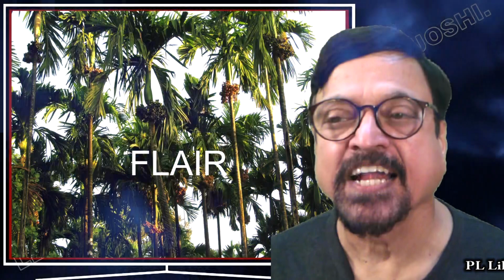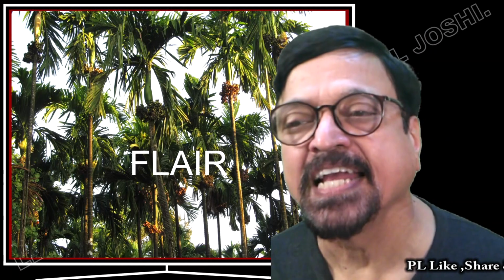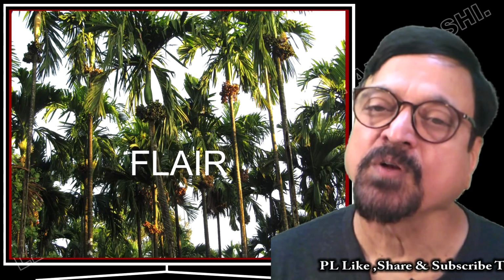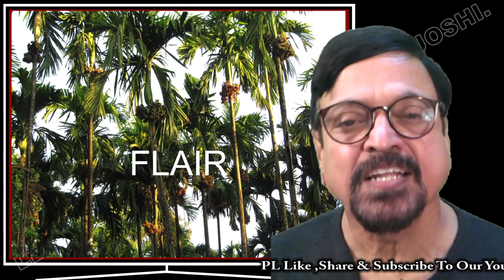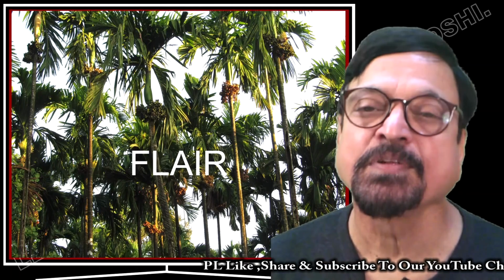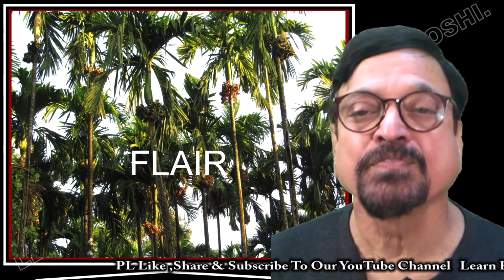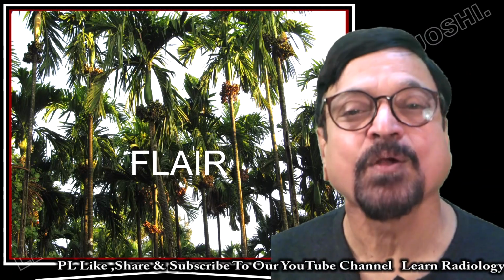With this, let's start going to the topic proper, learning of physics, that is particularly a sequence FLAIR. Why are there different sequences? It's very simple. If I give you a cross section of an abdomen, you will not be able to differentiate liver, spleen, kidney, spine unless there is a contrast between them. If everything looks the same, of a single color, then we cannot identify them. Now, to identify them, there have to be different grayscales allotted to them.